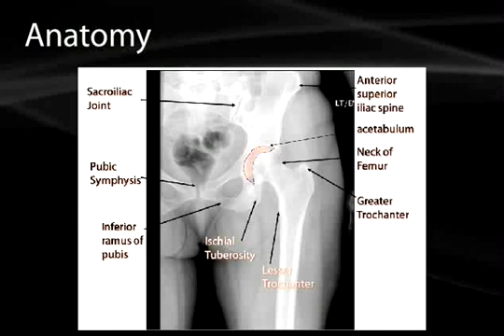And then a really important area that you look very closely at would be the neck of the femur and the acetabulum with the head of the femur as well. Look for good congruity. Look for the edges of the acetabulum to be nice and smooth. Make sure there's no broken edges, which will indicate that there could be some kind of cartilaginous damage or labral damage.